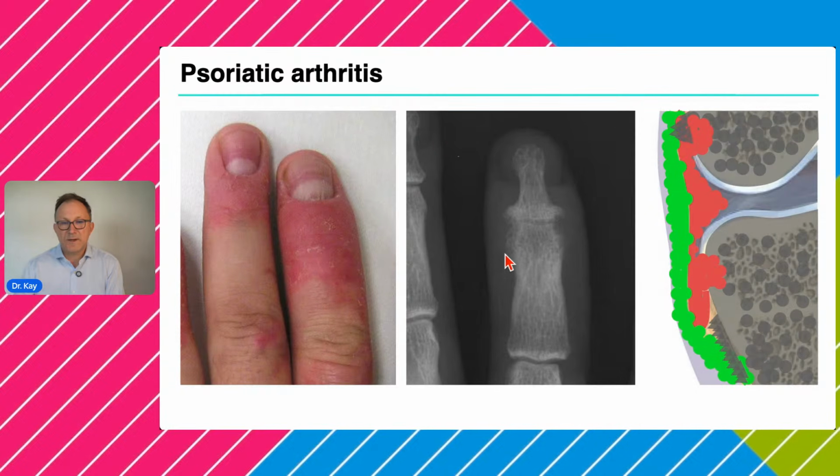So that means this is a completely different picture seen here with these defects in the bone and these ill-defined bone margins in a patient with severe psoriatic arthritis. However, in long-standing psoriatic arthritis, this picture is no longer visible, and it's very difficult to distinguish psoriatic arthritis from osteoarthritis in the long term. All right.